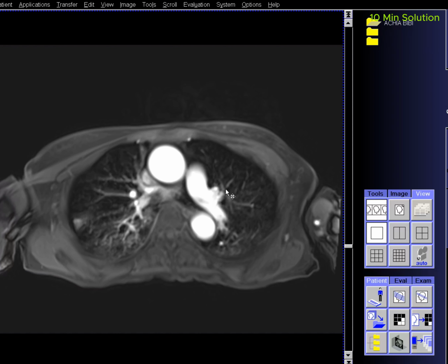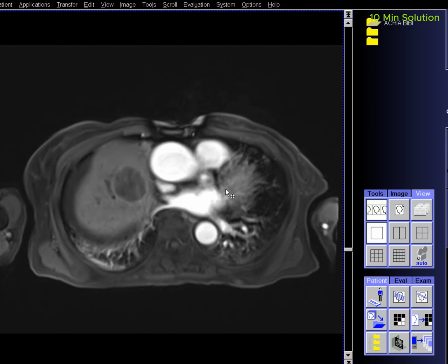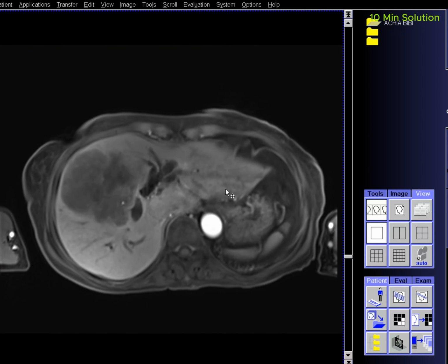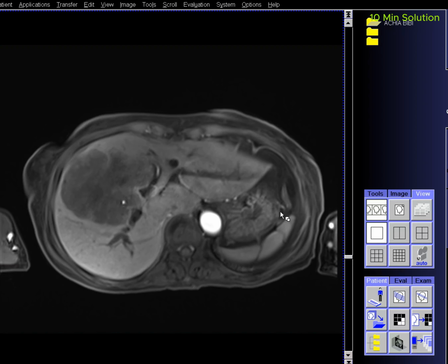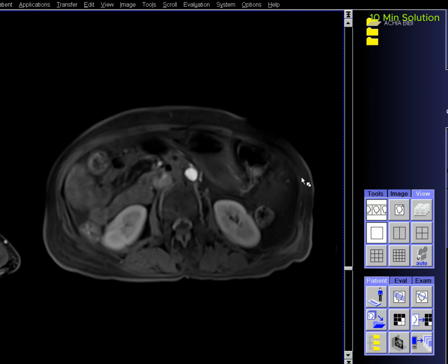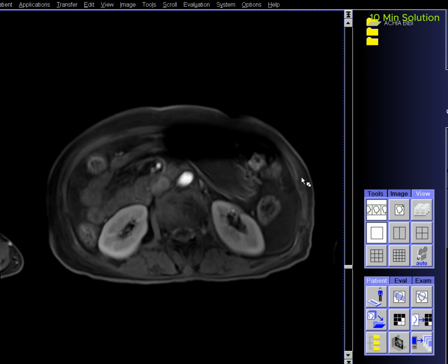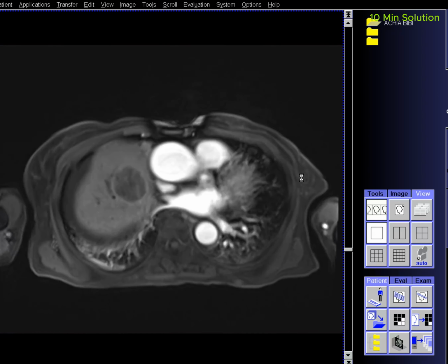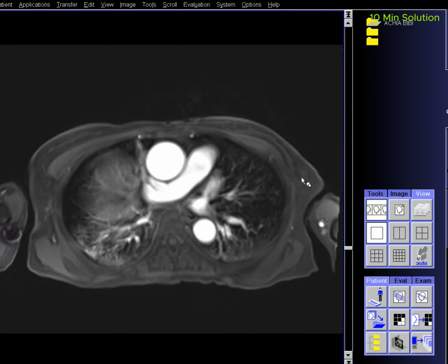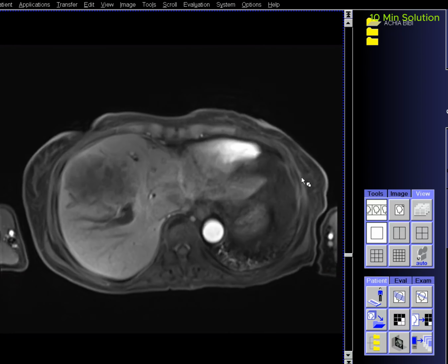Introduction. MRI is one of the most useful and rapidly developing diagnostic tools for evaluating liver pathologies. MRI allows the acquisition of images with excellent tissue contrast and anatomical detail. It is particularly effective in visualizing liver tissue and can detect and characterize focal liver lesions. The success of liver imaging depends primarily on the technique and optimization of pulse sequences.